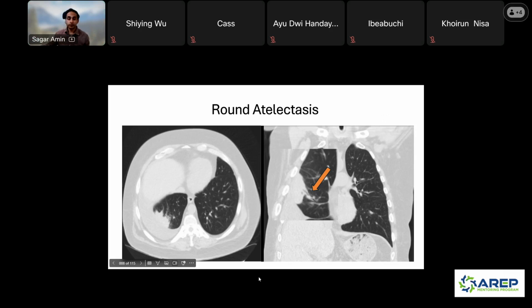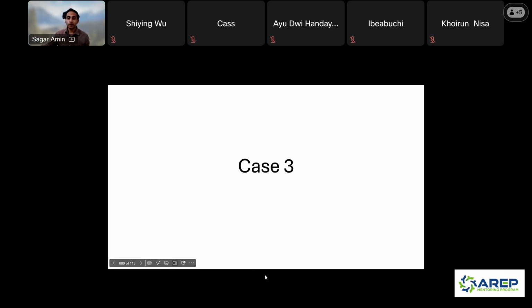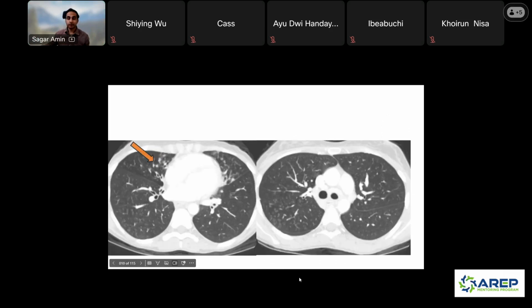All right. So we'll go ahead and move on to the next case. Anyone want to describe the findings here? Any volunteers at all? Okay. I see we have some more people joining as well.